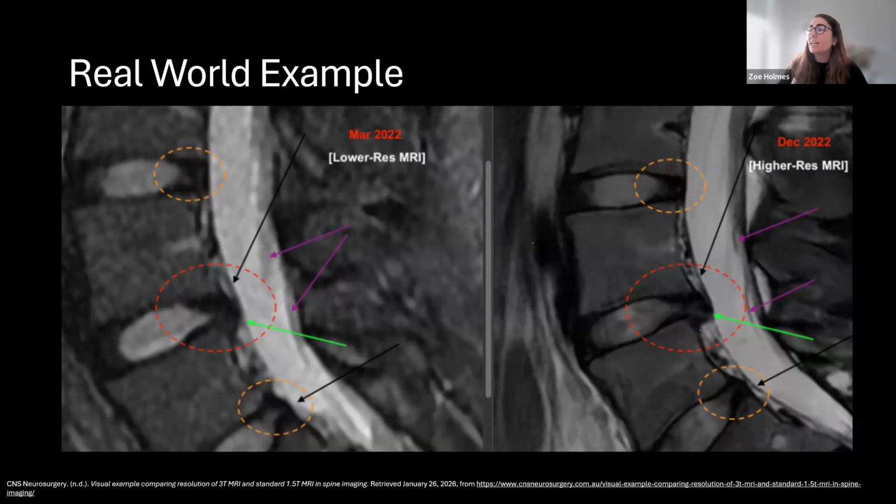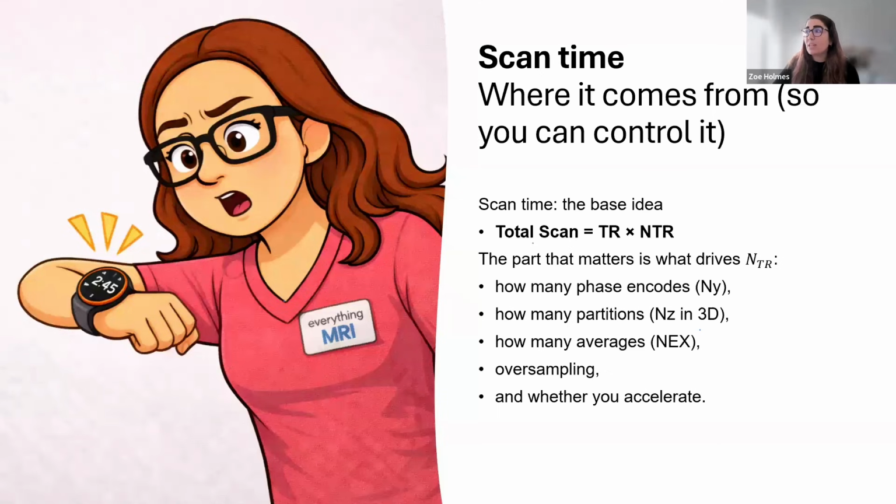So for this patient here, it's really nice to appreciate that herniated bulging disc on the 3T versus the 1.5. And we are getting a lot more structural information on that posterior chain as we go down, so we can assess the spinal cord and if there's any tethering of the cauda equina in there, and where the L5 nerve roots are too. So this is where resolution plays a very good role, especially when we're looking at our nerves, looking at really small, fine detail.